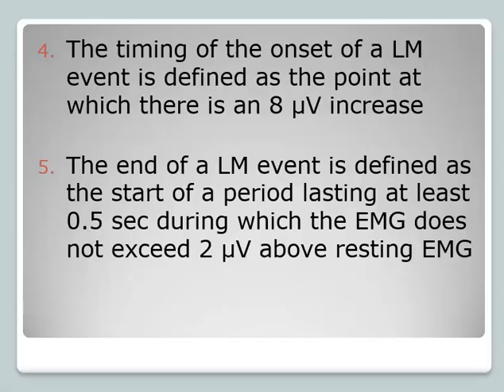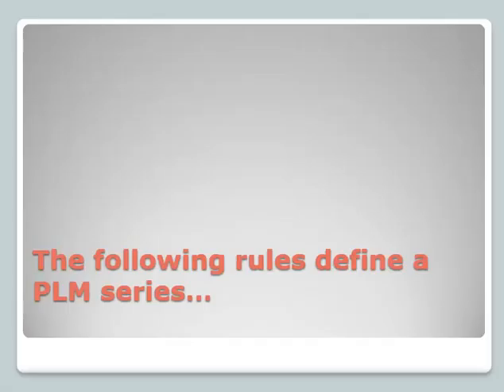The thing with this is, these are the rules, but with leg movements, you either see them or you don't. They're very clear. It's not like chin EMG, where you have these more gradual increases in tone and then back down. That's why we have these rules, for the very rare instances that you might have something like that. But with leg movements, you either have a kick or you don't. So we aren't spending time marking every single leg kick unless it's in a series.